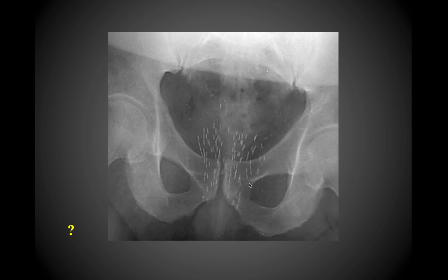In some cases with prostate cancer, one of the ways that we treat it is with radioactive seeds. This is what's called brachytherapy. There's a bunch of these little tiny radioactive seeds that are placed in and around the prostate to try to kill the tumor.